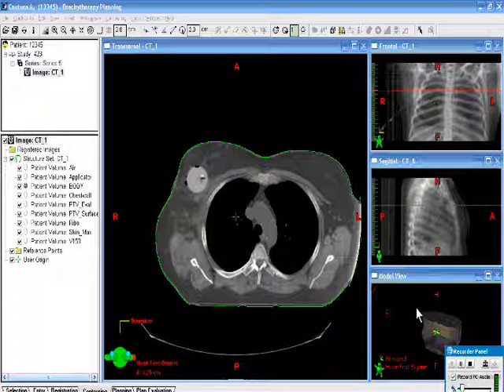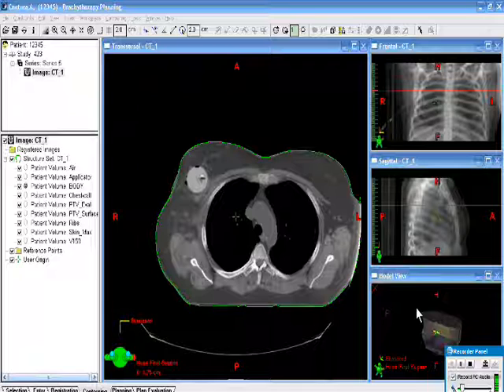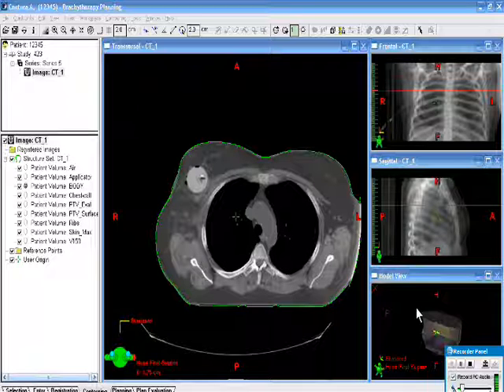Welcome everyone. We will be going through a couple of Contura cases today. There's a simple one which we will do first, and we will go through all the contouring and a little bit of the optimization and evaluation stuff. There's also a more complicated and challenging case that will be a separate recording, and you can find that later.